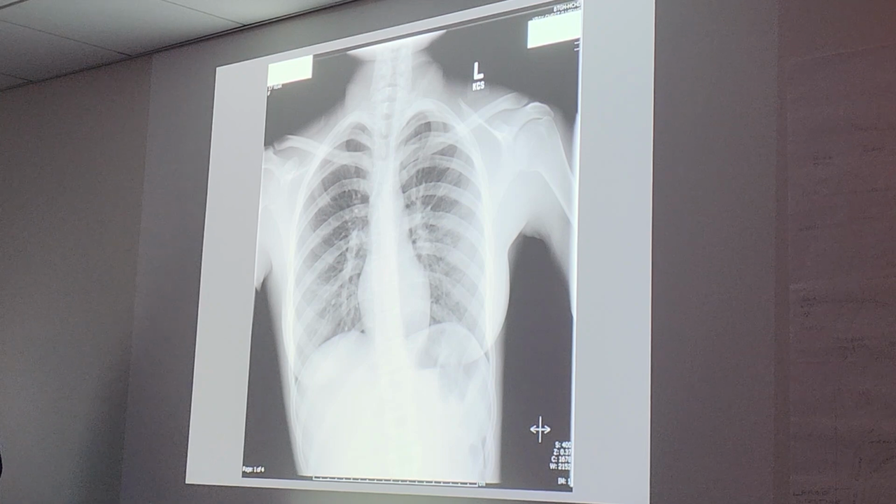Did you talk about the markers in the soft tissue? The markers are in the soft tissue, but they're not obstructing any anatomy that we want to look at.